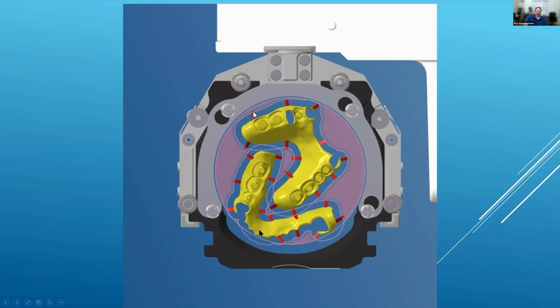What it really does for flexibles is allow you to protrude into an open space and free up, like these are two big partials. I'd never be able to fit two in a closed edge puck, because not only would I have to have some space there, but I would lose several millimeters. So that open edge bracket's really nice for making sure you fit multiple cases in one puck.